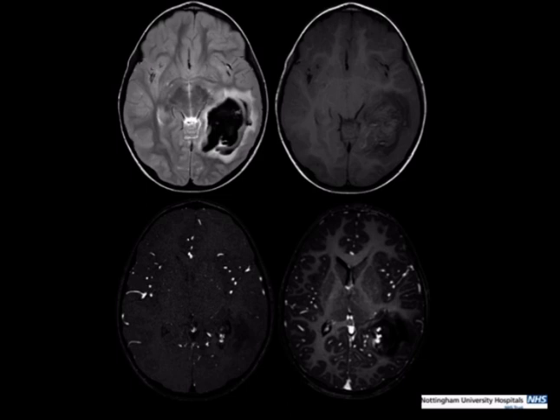And the reason that's useful is most of us use time of flight imaging for the angiography. And if this was full of blood, there's T1 shine through on time of flight imaging, and that would obscure these abnormal vessels and also the contrast enhanced imaging. But what this actually shows is an AVM with a little pseudoaneurysm deep next to the hematoma, which we would have missed had we performed the scan any later.